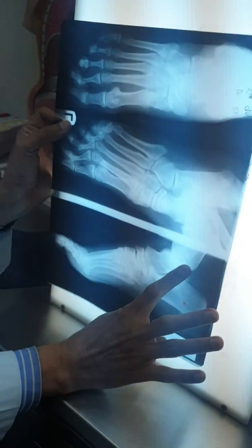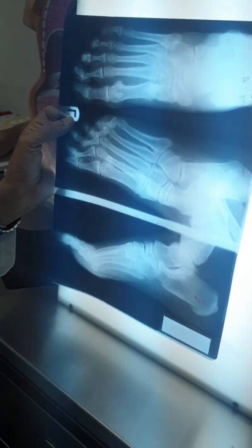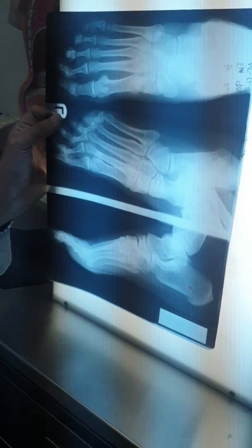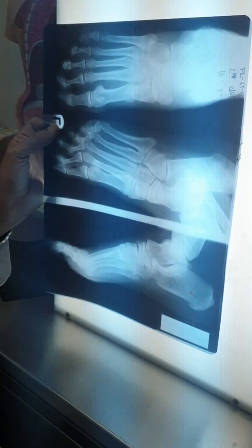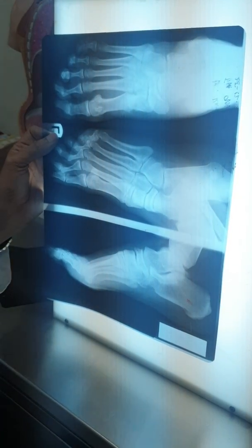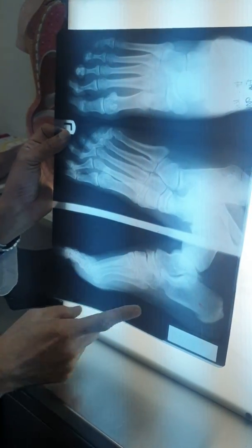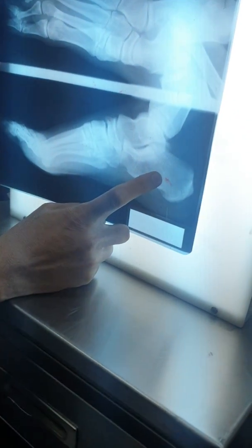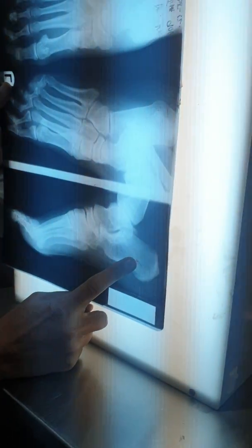This is the lower end of the tibia and the fibula behind it. Now, the bones of the lower limb you can divide into three groups: tarsal, metatarsal, phalanges. Just like in the hand you see carpal bones: scaphoid, lunate, triquetrum, then metacarpal, phalanges. In the tarsal bones here, you see the calcaneum, the biggest bone, the heel. You put your heel here.